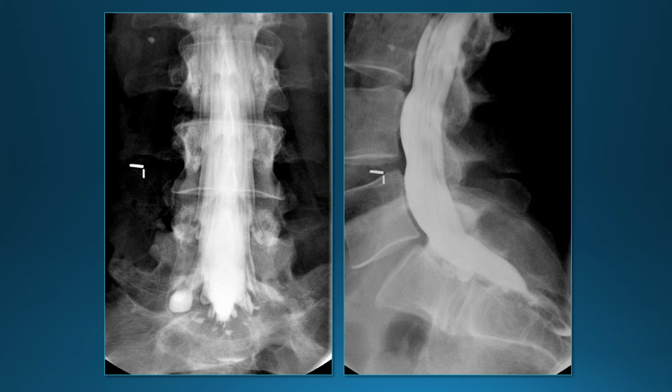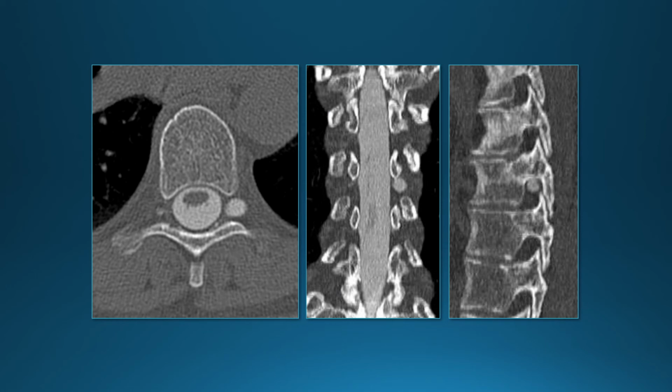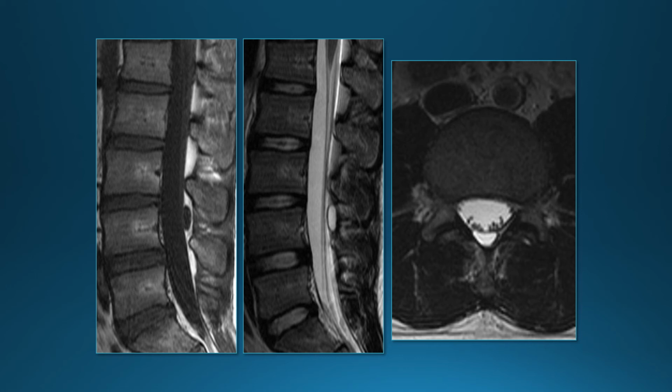So another patient with a Tarlov cyst associated with a root sleeve. The most common are in the lumbar and sacral region, but you can see them anywhere in the thoracic or in the cervical region. So they can occur anywhere. There's another patient with an extradural arachnoid cyst. This is not a Tarlov cyst. It's a different variety of extradural arachnoid cysts. These are congenital. You'll see these occasionally. They're generally incidental findings.